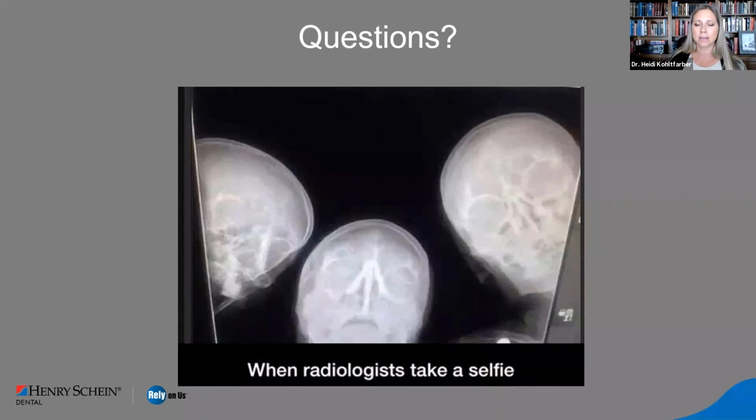In that case, we're going to see very well-defined cortical borders. It's a slow-growing entity. It will remodel the lingual cortical border of the mandible. And with any slow-growing entity, it has time to remodel. The appearance of it with very thickly corticated borders is pathognomonic for the entity. In the beginning, they'd send them off for MRI, being kind of worried about what's there. But because the visualization, even in our osseous structures, is pathognomonic for it, we no longer do that.